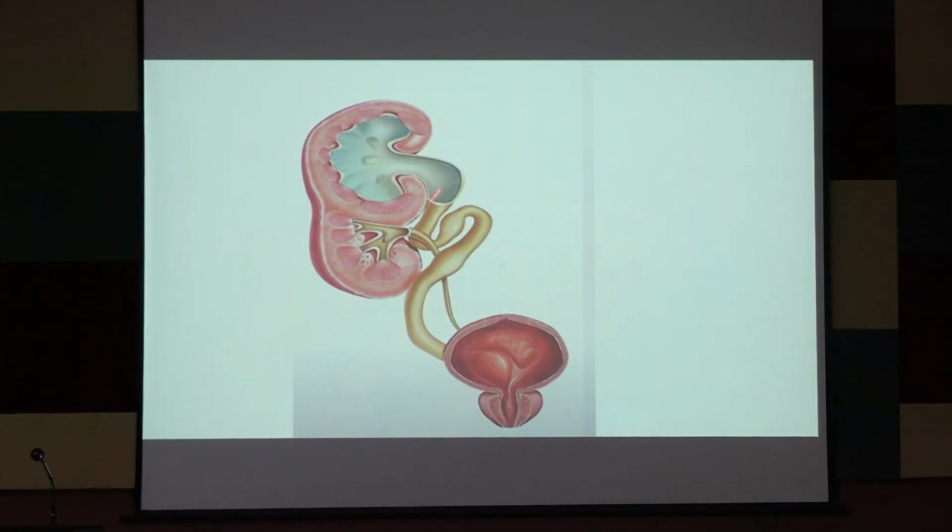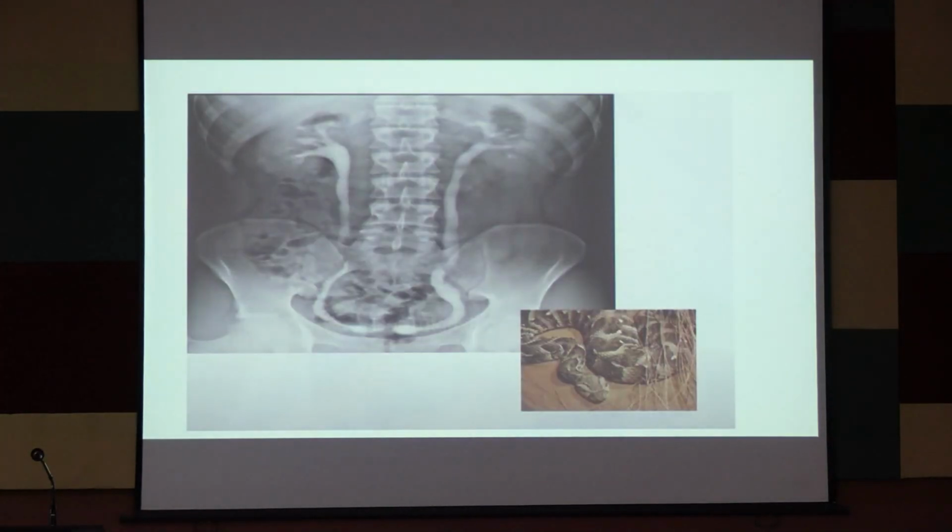The entire upper moiety has become so enlarged that it has compressed onto this particular one and it has started to droop below. Now this enlargement can be because of two things. One is an obstruction, maybe associated with a ureterocele. The other cause might be an RCC, renal cell carcinoma, which has enlarged in a duplicated system and compressed onto the segment. So don't judge only on one thing, that it's only a non-functioning segment; it can be an RCC as well. Okay, we'll be finishing the class today.